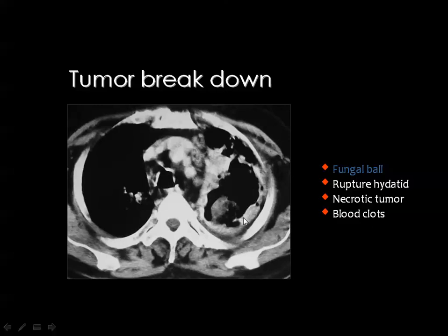If you see a cavity in the lung fulfilling the criteria of malignancy, which are thick margin and irregular inner wall, whatever the content of this cavity, you should diagnose malignancy. If the cavity contains air, a ball, or a fluid level, you think of malignancy, provided you have these two criteria: thickness of the margin and irregularity of the inner wall.